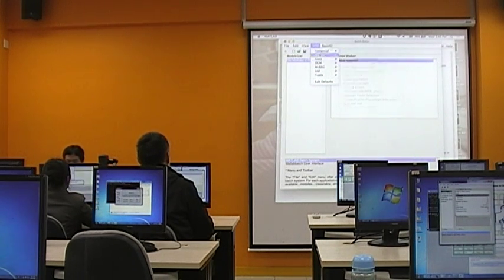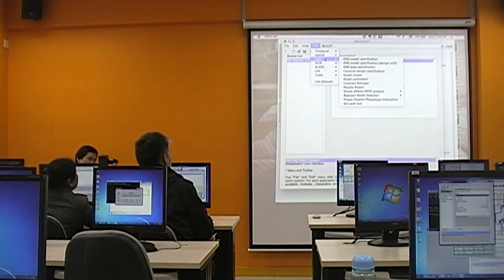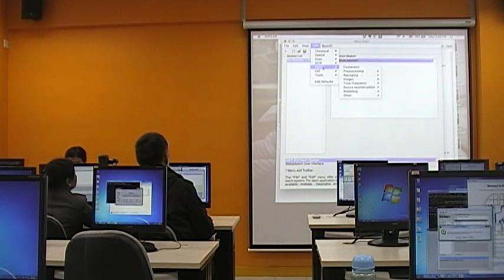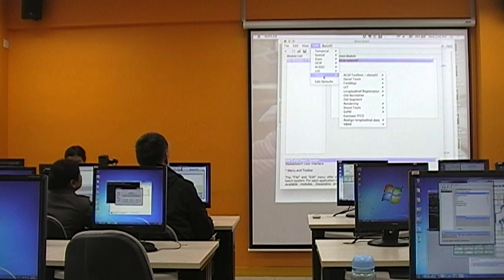Right. So here we are moving from the temporal processing domain to the spatial preprocessing domain, to statistics. So you will also see that, okay, there are DCM and MEG, EEG, some utilities or some tools.